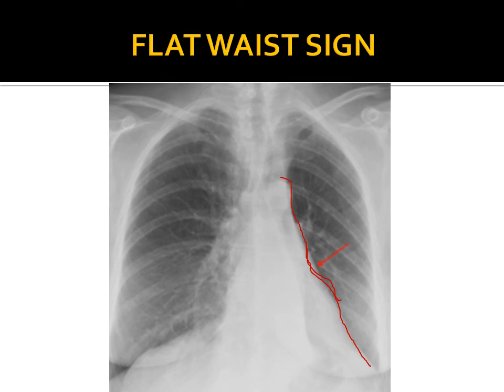Usually these are known as the four mogul contours of the heart: the aortic knuckle, the first mogul; pulmonary artery, the second mogul; and the left heart border, the fourth mogul. The third mogul is the left atrial appendage. In this case, we cannot make out the outlines or contours of the respective structures forming the left heart border. It is seen in left lower lobar collapse.